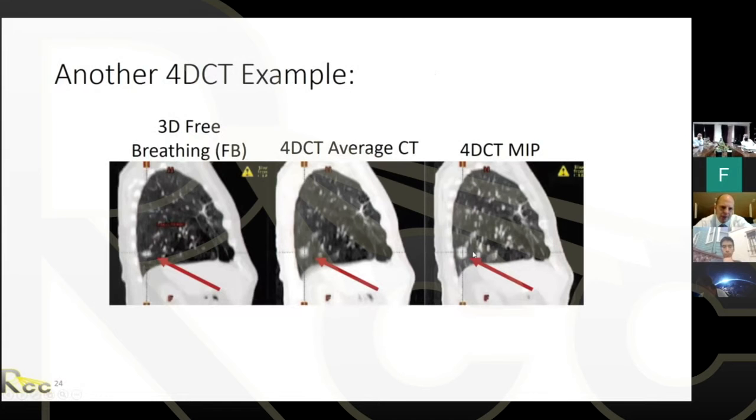So here's an example you can see. On the left, this is a standard free breathing CT, and you can see the target there. And as you can imagine, each slice of this is really just a snapshot of the patient at one time point.